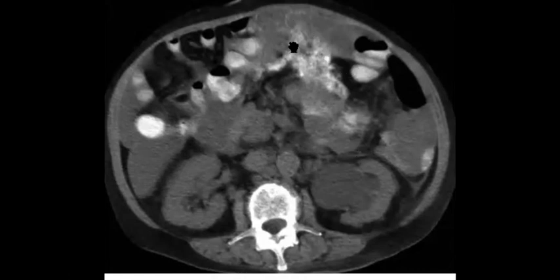Maybe you will need a guided biopsy for the omental lesion or the peritoneal metastasis, and you will need CT for distant metastatic staging, or PET CT. So in this case, it can be primary ovarian cancer, or it can be gastric cancer, but with this appearance and this progression and the stomach mass, it is primary gastric cancer.